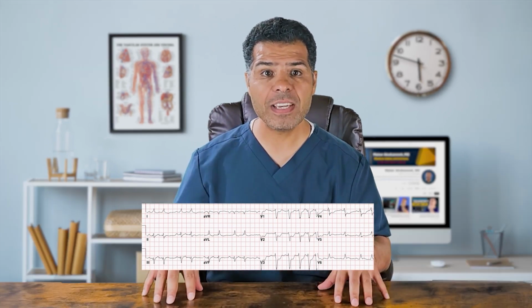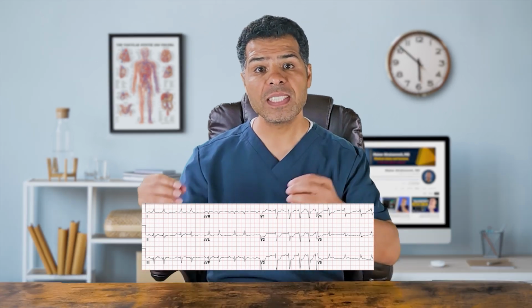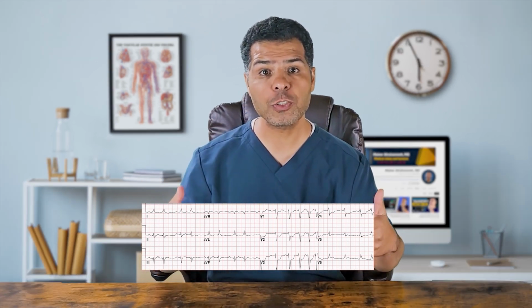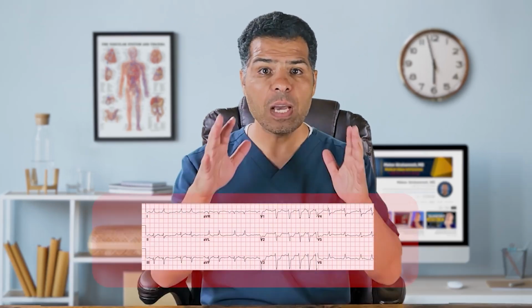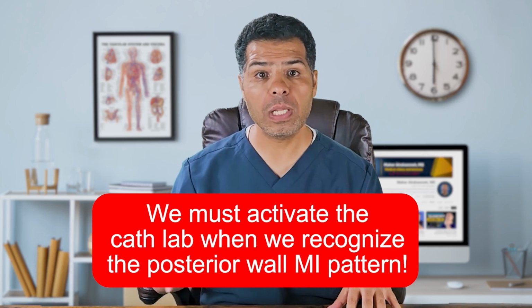Remember, the ST elevation in posterior leads will be subtle if you do posterior leads, since these leads are further from the heart and must penetrate through the electrically insulating air of the lungs. Now, we must activate the cath lab when we recognize the posterior wall MI pattern.